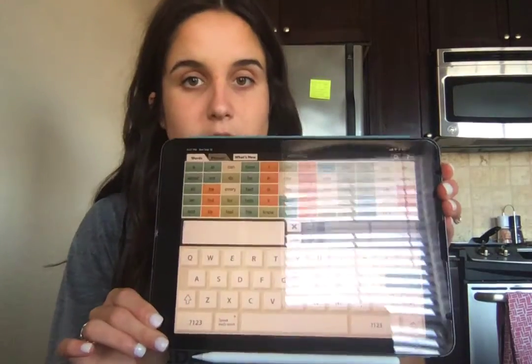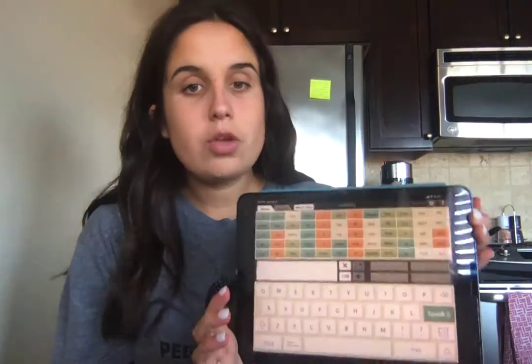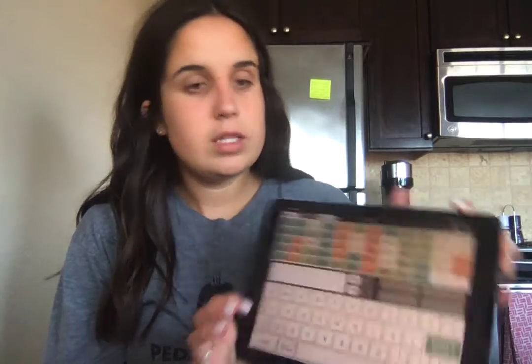Something that I noticed while using Verbally is that the vocabulary and the phrases are both very basic. So it has a lot of just very simple words, nothing too crazy. And then they also don't have any icons. It's just the box with the text in it. So there's no pictures on here. But you are able to speak or not speak with Verbally.